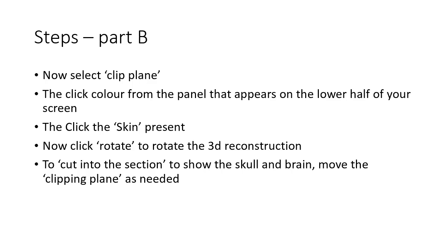So we'll see what this process gave in the next slide.